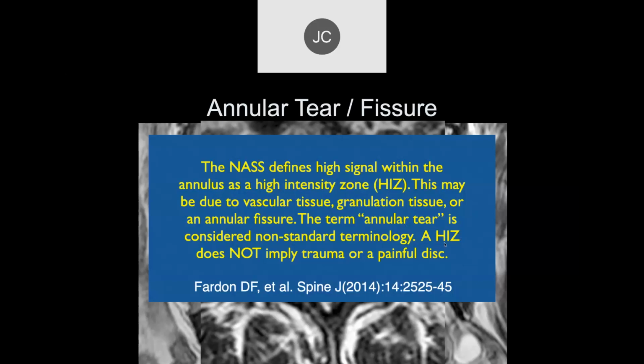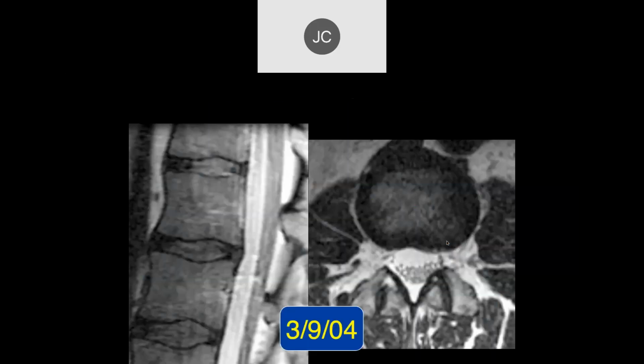Also, most studies show that there's very poor correlation between high intensity zones and the presence of recent trauma or a painful disc. So the only thing it really indicates is that you're dealing with degenerative disc disease, but it can be associated with other things. So this is just information here.